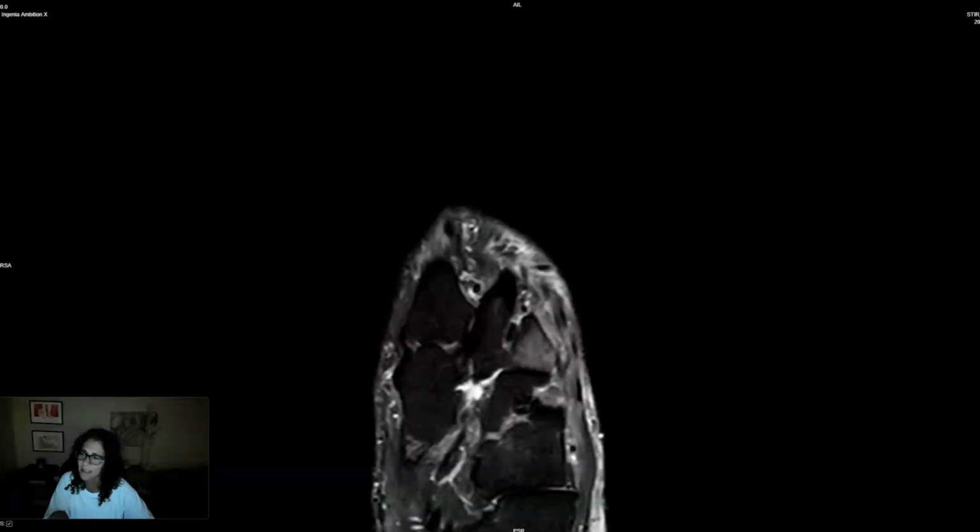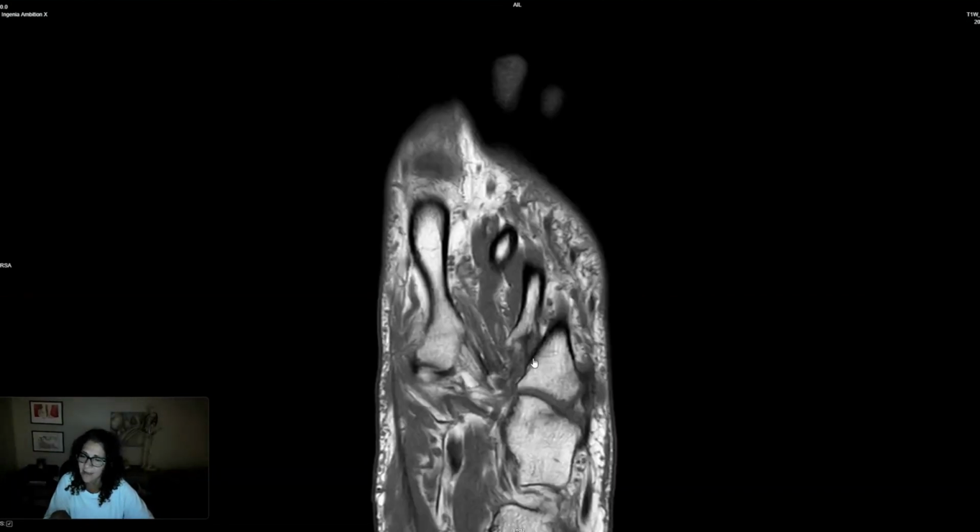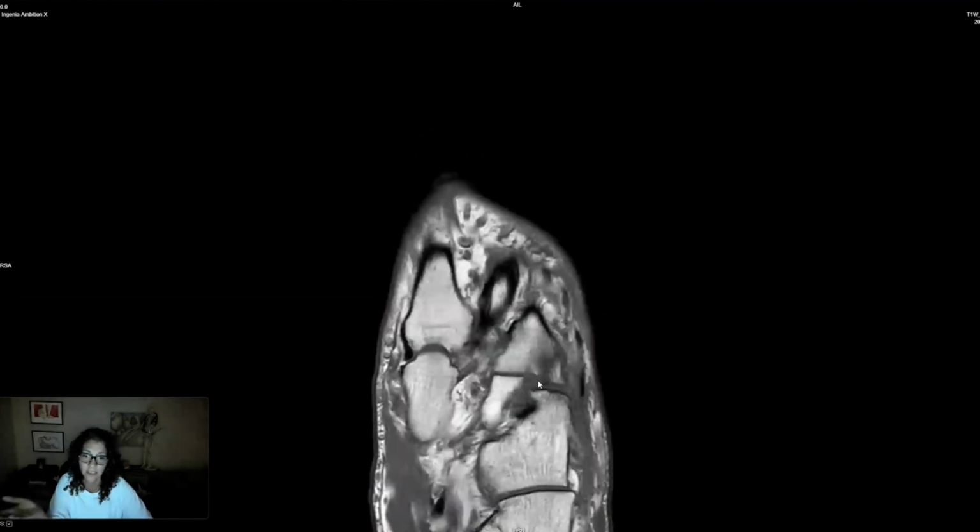Now, what I want to understand there is, do I have a fracture there? Is there a fracture line I can see? And what I don't see is a fracture line. I do see some degree of a bone erosion, perhaps where there's a loss of cortex in this location. So that's what I see in that location.